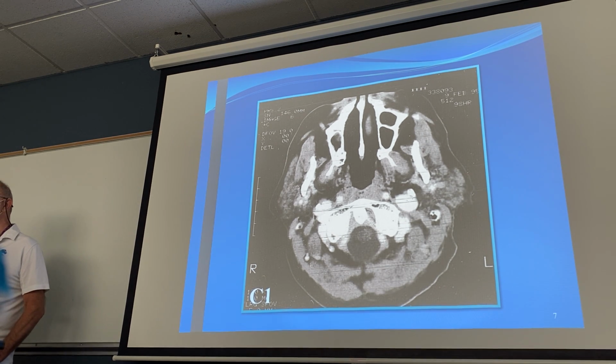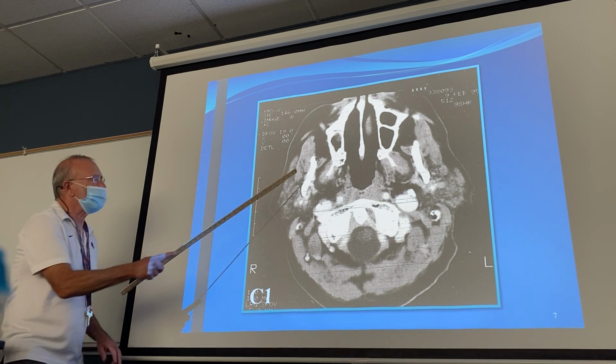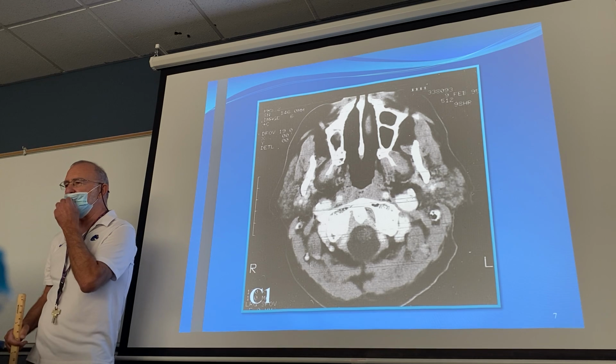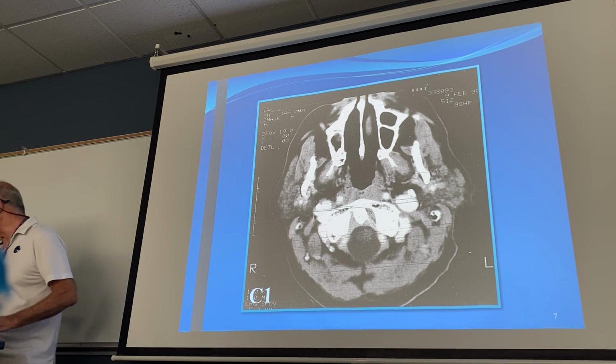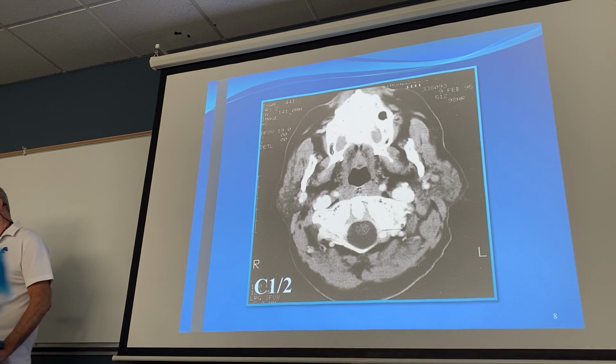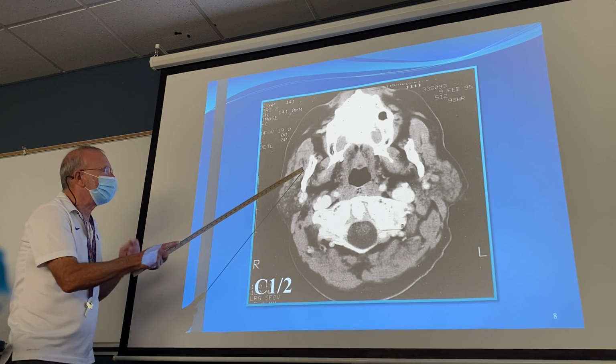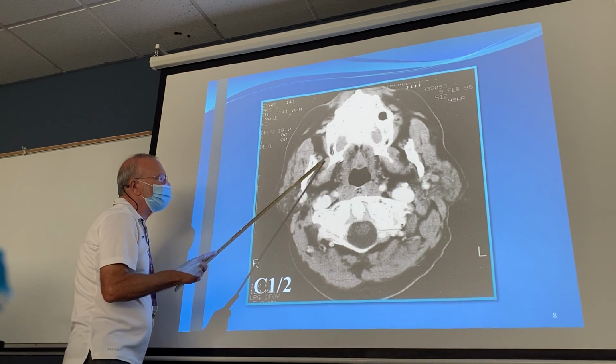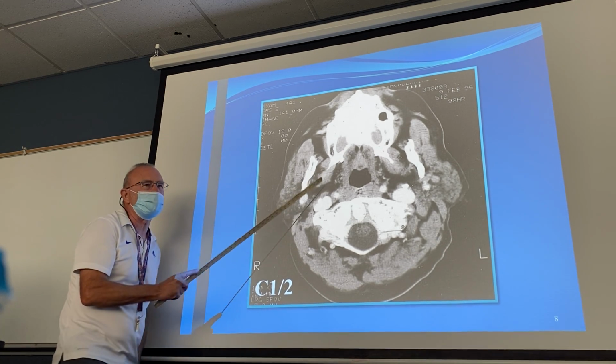Yes, ma'am. The masseter is going to start showing up here, miss. It's always going to show up on the lateral aspect of the ramus. Let me go down another level, Caitlin, and show you here. It's a little better view of it right here, miss. Right here is masseter, right over here. Now this is re-expanding into medial pterygoid muscle.